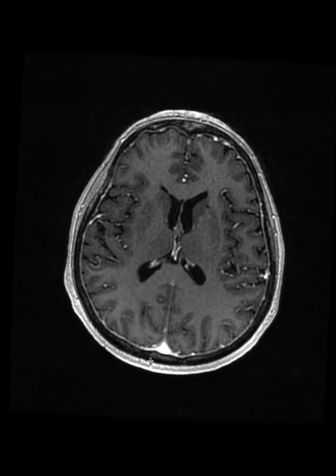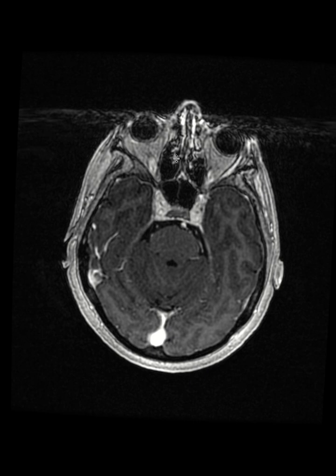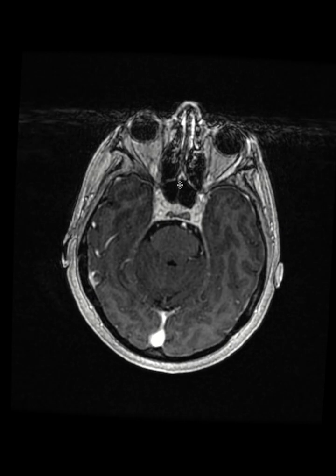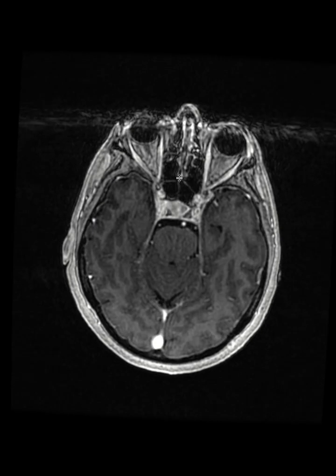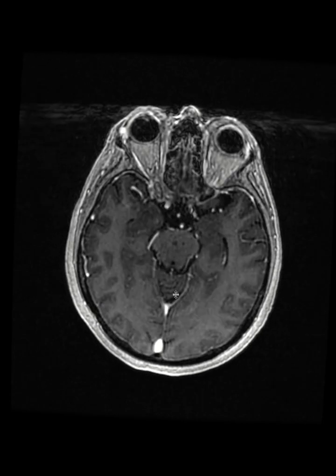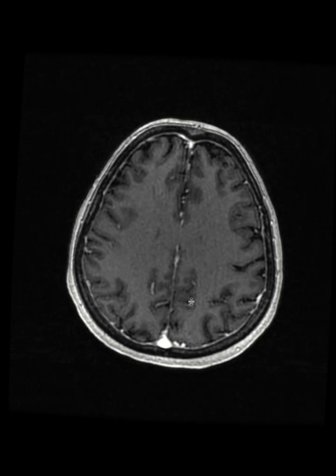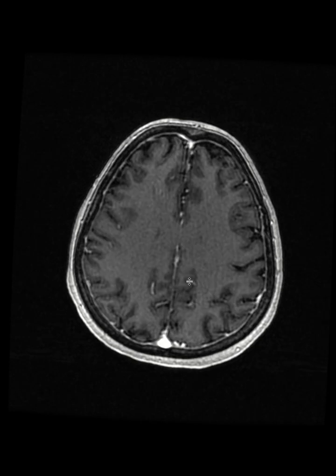And the way I know is because you see this enhancement in the sinonasal mucosal areas. These are enhancing because that's a normal appearance of the sinonasal mucosal region to have enhancement with gadolinium. Also, I see that all the dural venous sinuses and all the vessels are also bright. If this one didn't have contrast, you would know this is a T1 sequence. Specifically, this is a T1 sequence, but it's T1 post-contrast.